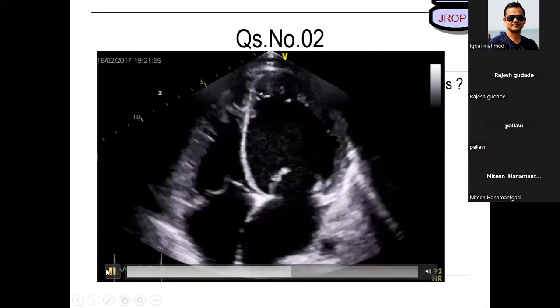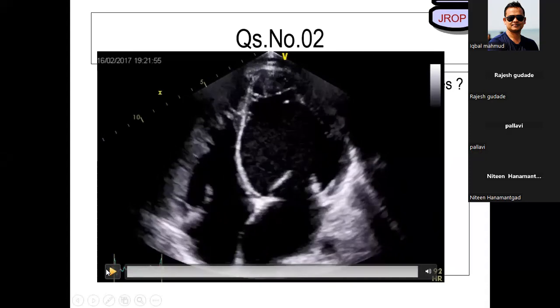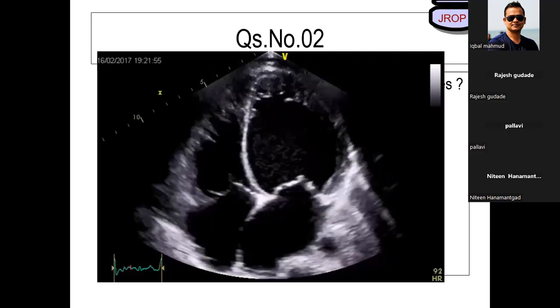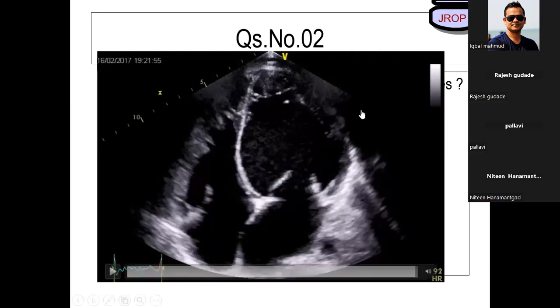Very good depiction, Sanika. Tell me something very important in this patient. There is a trabeculation present. Where is the trabeculation present? In the apical anterior, apical lateral side, sir. Even the RV side also, apical RV level also. So what are these?